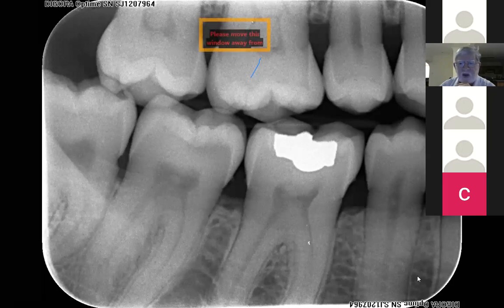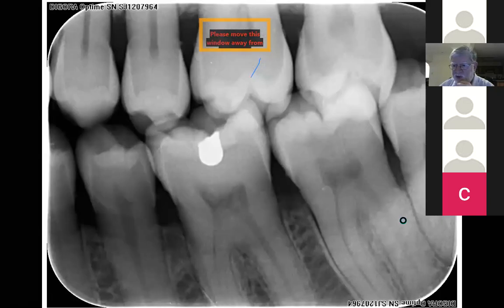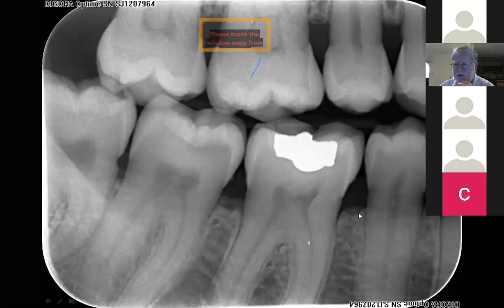Okay, fine. So early chronic periodontitis. For some of the early year students, I'll be saying to my patients where bone meets anything other than bone, where bone meets the tooth, where the bone meets the gum, it presents itself as a hard compact layer.